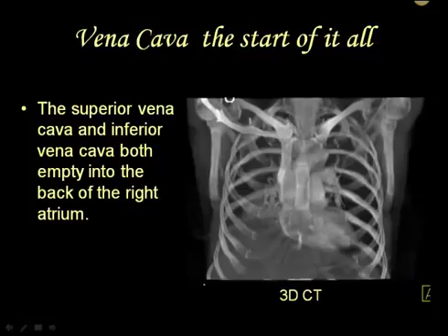The arms, when the patient is laying in the scanner, are brought up above their heads. As a consequence, as you can see here, there is the head of the humerus, ditto over here. You see how the scapula have been pulled away and all of that. They put an IV into somebody if they're going to use IV contrast, so it's usually going to be in the antecubital vein. In this particular case, it's from the right side. What you're seeing here is the flow of IV contrast media through the venous system, and specifically in this area here, this would be the axillary vein.